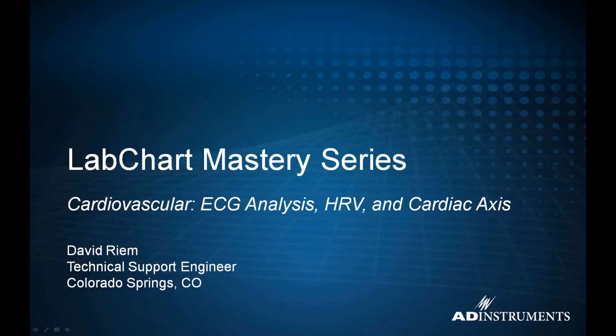Thank you for joining us for another one of our Lab Chart Mastery series. Today we're going to discuss cardiovascular analysis, both using our ECG analysis module, our HRV module, and the cardiac axis extension. Unfortunately, Brandon Boucher could not be with us today, so I'm taking over for him.